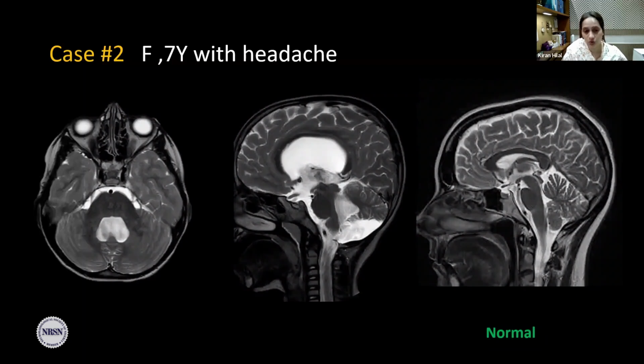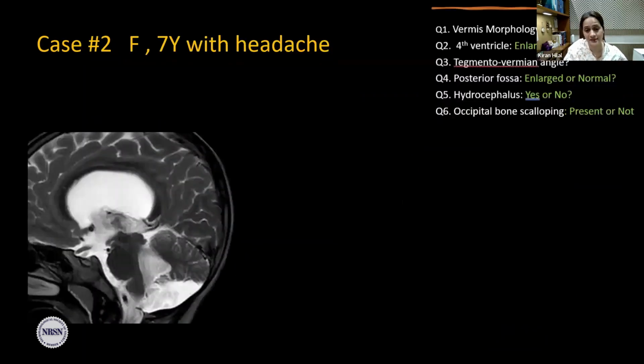Now let's try to again solve this case with our 6 question systematic approach. Again, my question number 1, vermis morphology.